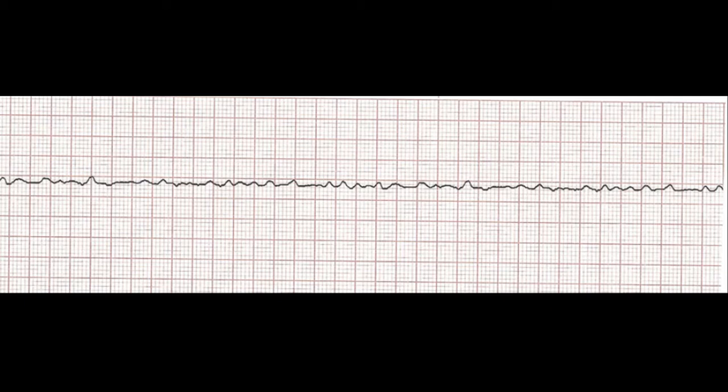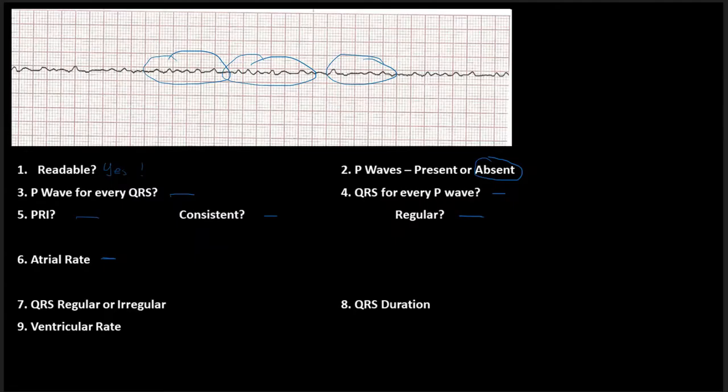If I take a look up here, even if I take this clump here, it does not look like this clump in here, or come down here, nothing looks alike. There seems to be no pattern to it. So I can't tell whether or not there's a QRS. I'm kind of stuck with all of these things, and I'm saying it almost looks like an artifact. It almost, in some cases, appears to be an unorganized mess. I know it's really medical for you, right? There's nothing in here that tells me that this is really organized at all.